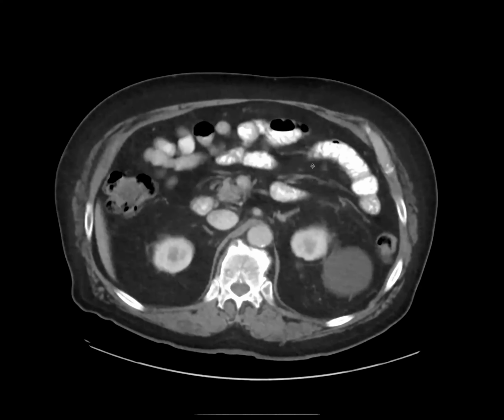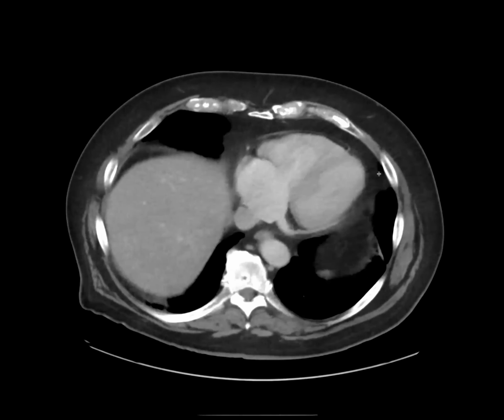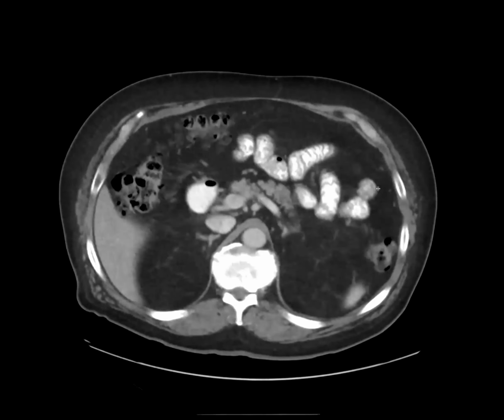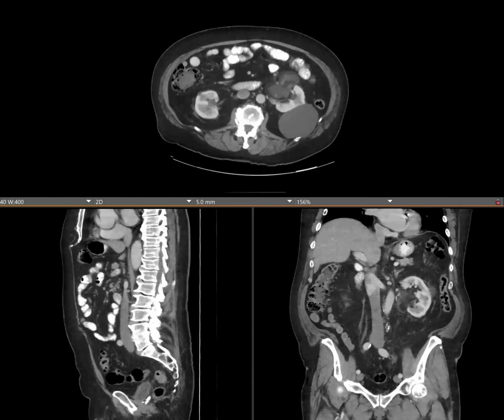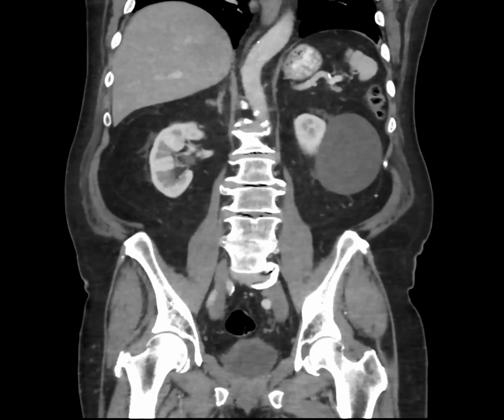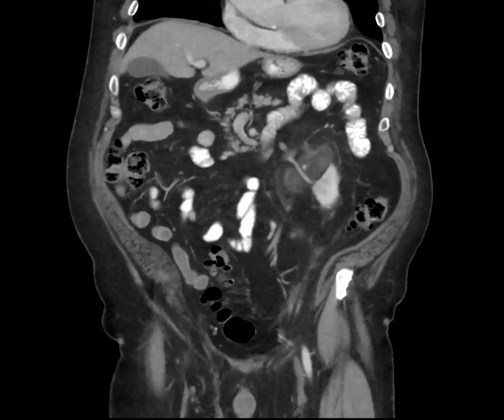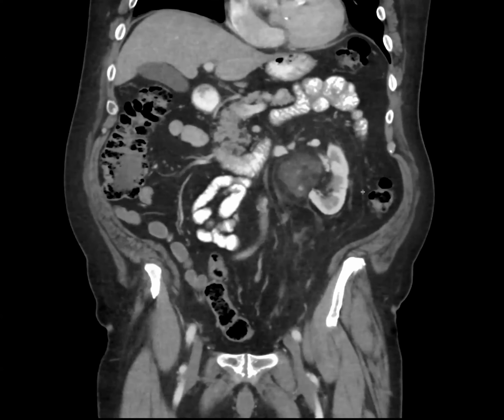So this was a patient in the 70s. The patient had a prostate MRI, and then he had prostate cancer, so a metastatic workup, and they found this. So what are the differentials, what else could it be? That doesn't look good. I feel like it looks benign. But given the fact that it has those big vessels in it, I'm thinking angiomyolipoma.